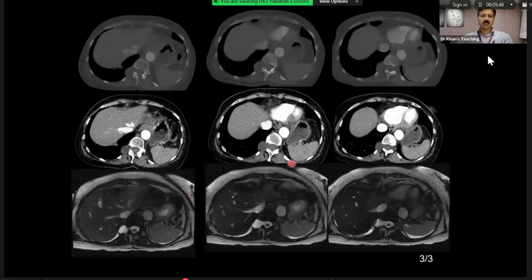So this is a case where dural ectasia can be seen incidentally. The take-home point is that it might be an incidental finding. On a CT scan, if you see it, you wonder, is there a tumor sitting there? You do an MR, and it is just CSF. So this is dural ectasia, and there is no tumor sitting in it.